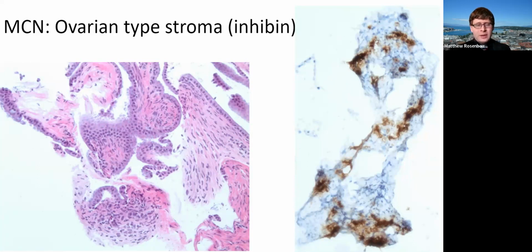So your best hope, even this, I've had very few cases of core needle biopsy where I get good stroma. This is probably one of my few cases that I have for that. So it's going to be a tricky one to delineate on cytology and small biopsy.